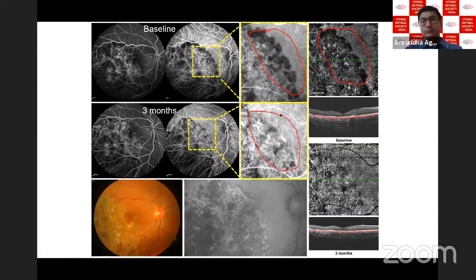and what you have is the disturbance of the choriocapillaries. There is a lot of choriocapillaries atrophy, and you're able to see medium to large size choroidal vasculature. If you do the OCT angio, again, you're able to see the same thing, a mishmash of medium to large underlying choroidal vessels, and you have a choriocapillaries atrophy, and this is different from your baseline image because here you do not have the area of flow deficit. So your lesions have healed, but they have healed with a lot of choriocapillaries atrophy.